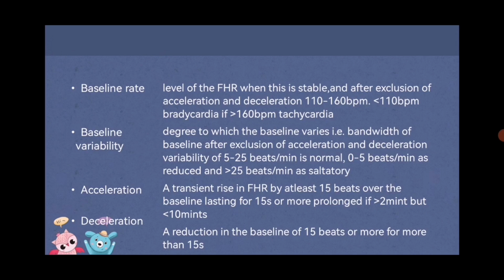Acceleration: a transient rise in fetal heart rate by at least 15 beats over the baseline lasting for 15 seconds or more, or prolonged if more than 2 minutes but less than 10 minutes. Deceleration: a reduction in the baseline of 15 beats or more for more than 15 seconds.